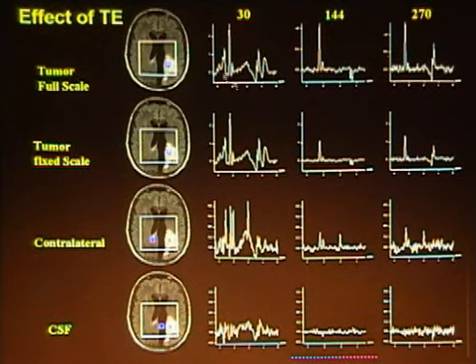So if you look at this first spectrum, within the tumor, you can see that there's increase in choline, there is decrease in NAA, there is this lactate lipid peak. So the lactate at short echo time is above the baseline, and it's a doublet, and it becomes below the baseline at intermediate echo time, 144 milliseconds, and then it's above the baseline again at 270 milliseconds.